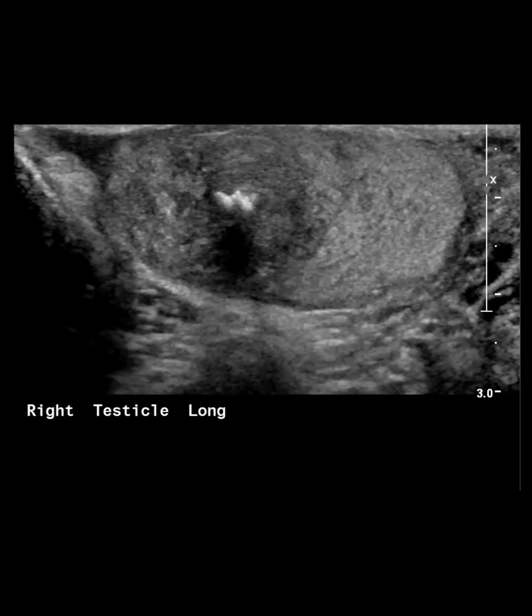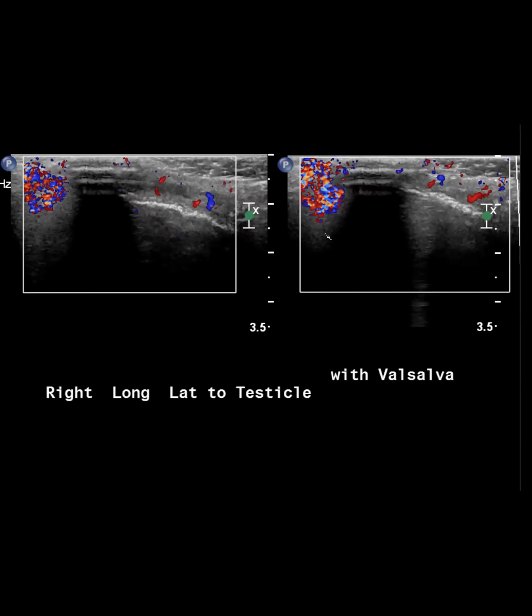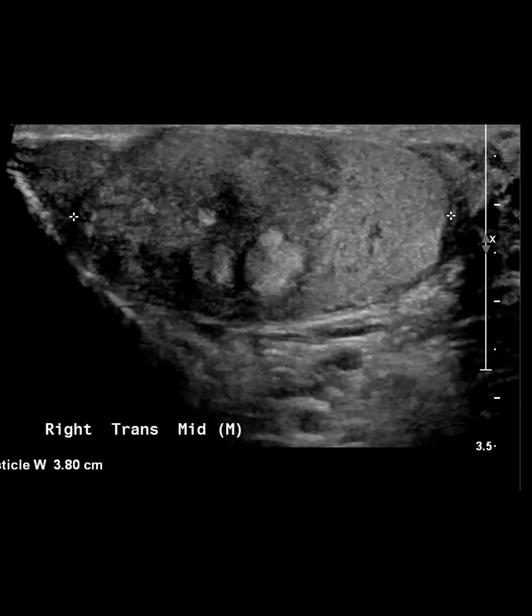Yeah, because if I was just looking at this without a high pretest probability, it would only be a differential. There's no way I would be able to say it's not malignant. Yeah, in the absence of endocrine abnormalities, concurrent CT, or in this case, high clinical suspicion.